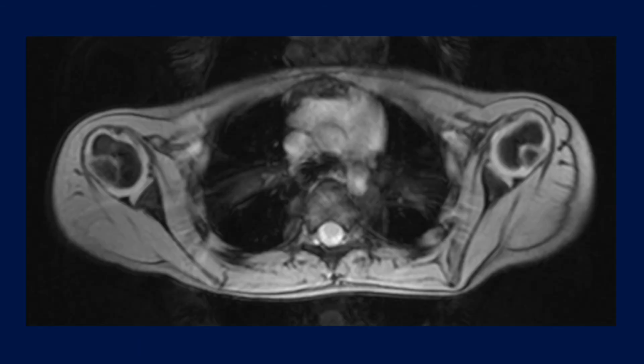This is a cartilage-sensitive sequence in a child who had been successfully treated for brachial plexus birth injury. There is some difference in the axis in which the glenoid is held, but we can see both humeral heads are well seated within the glenoid, and we can measure the glenoid version bilaterally by drawing a line along the axis of the scapula from the midpoint of the glenoid to the most medial aspect of the scapula, and then drawing a line parallel to the glenoid. The angle subtended here, minus 90 degrees, would give us a small amount of retroversion bilaterally, which was symmetric.